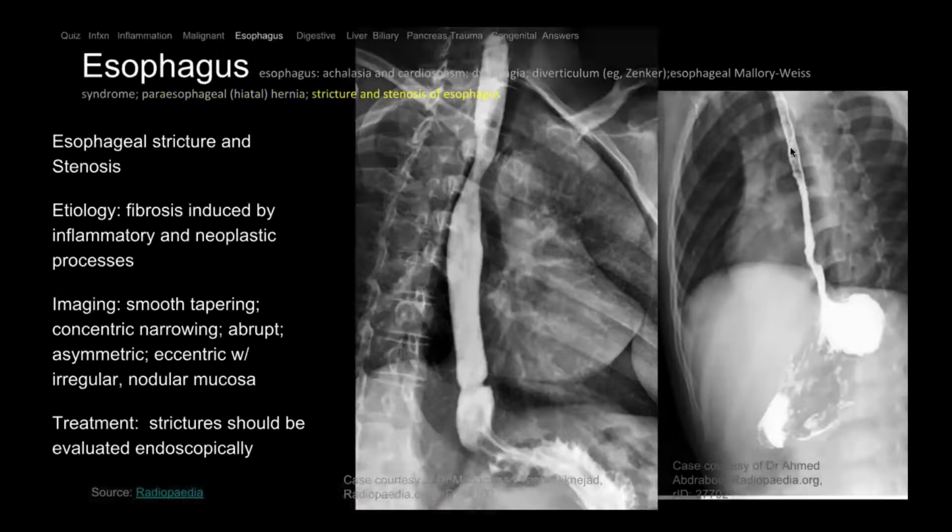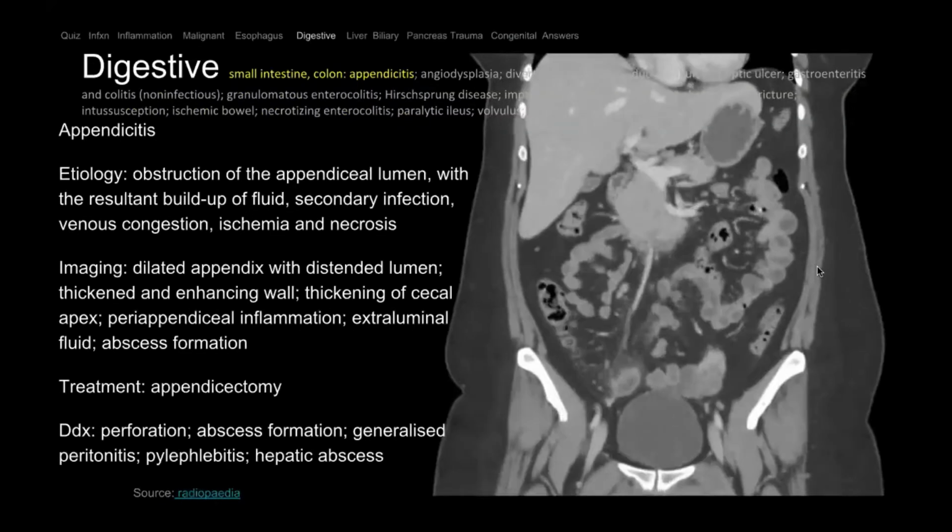Here, you see that there's abnormal distension, right? So this is a normal distension of the esophagus, but here it's just a straight, narrow pipe tube. And this is stricture. It's a long segment stricture of the esophagus that can happen from radiation. Patients who've had prior NG tube placement for a long time can stricture down, or people who try to commit suicide and drink lye can stricture down the entire esophagus.